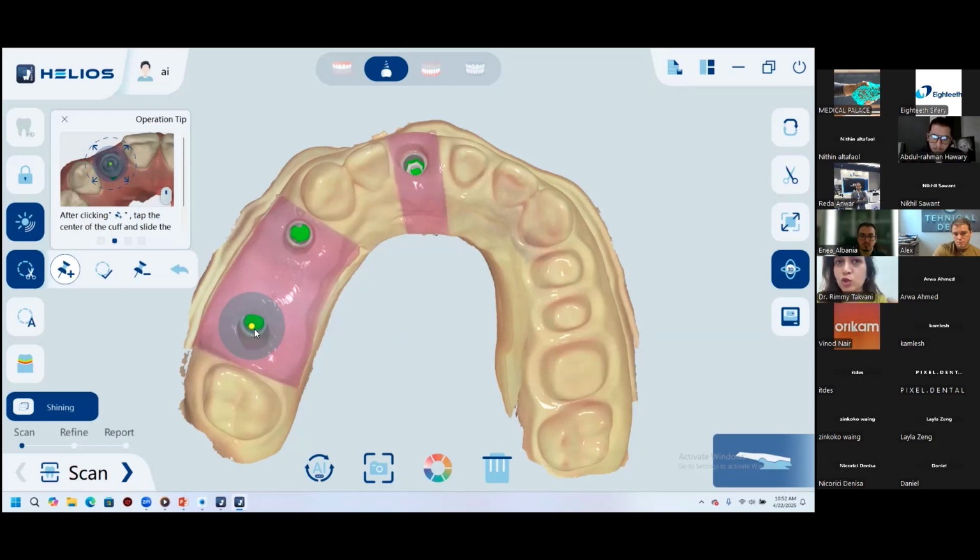It will be something close to 25 frames per second. So now if you see that one scanner is giving you 300 frames per second, another one is saying 25 frames per second, you would always have a tendency to say, okay, this scanner is faster. But this one is recording 25 videos in 1 second, and this one is taking 300 pictures in 1 second.